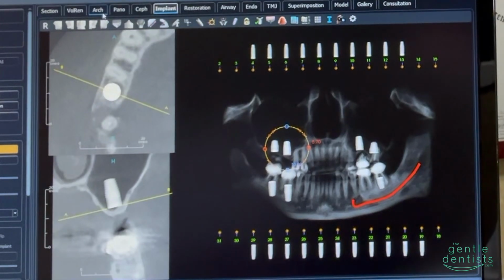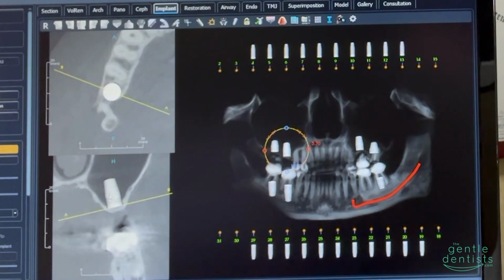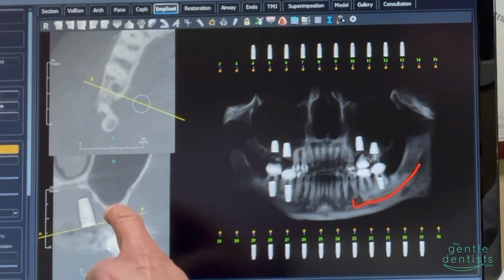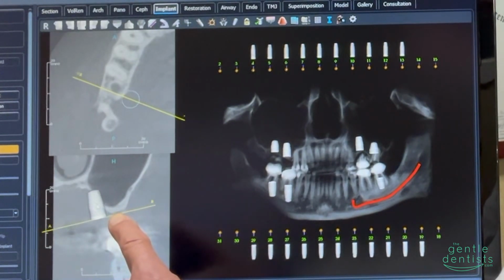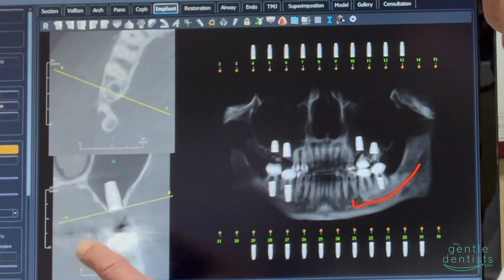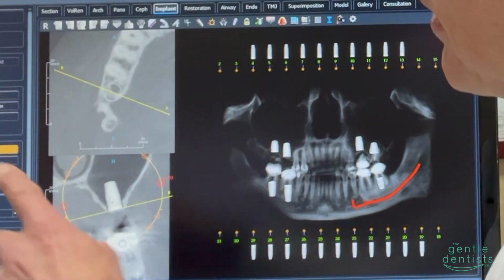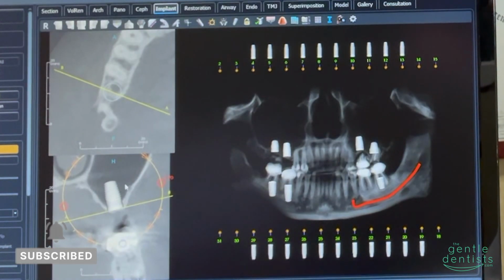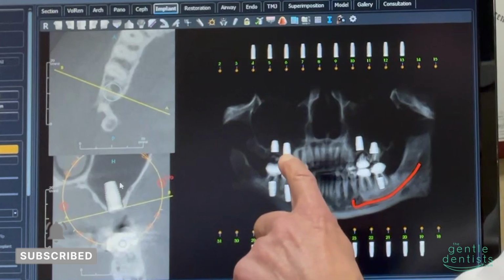What I do want to show you is that in this situation, for example, where this implant would be right here, this patient has extremely little bone, about 2 millimeters of bone right in this region. It's obviously not enough room to place an implant. This would be a virtual implant that is around 10 millimeters long. And so we have a lot of sinus. This is the actual sinus, sitting right in this region here.